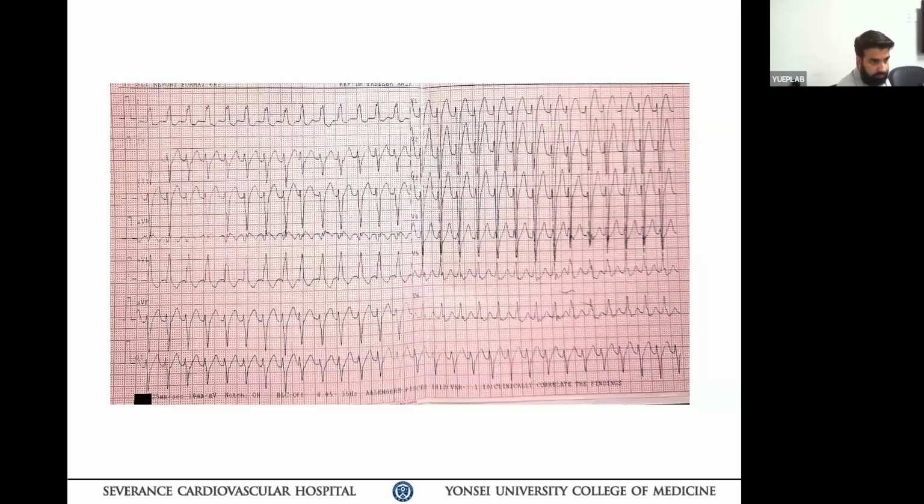Putting it together, my first differential, because of the AV dissociation, will be VT, but a close second differential will be SVT with aberrancy.